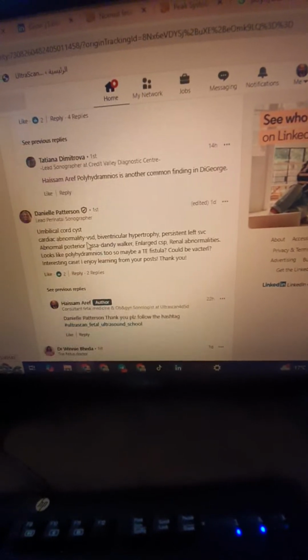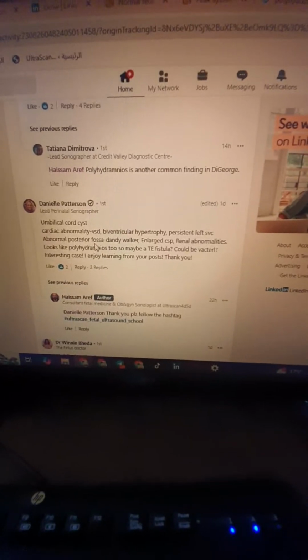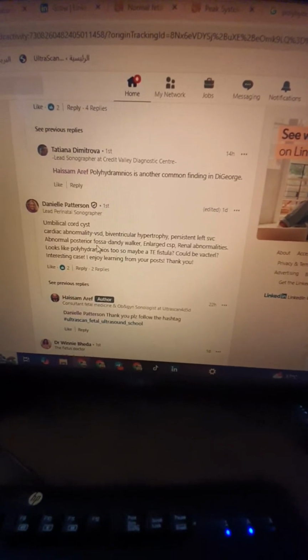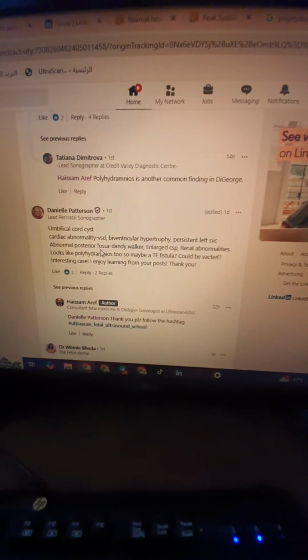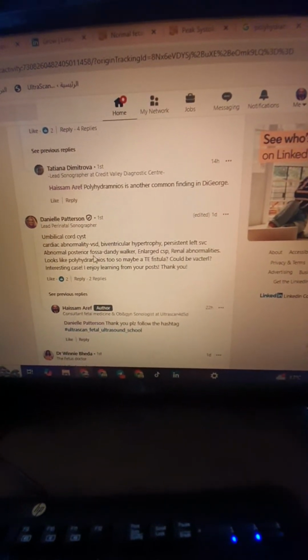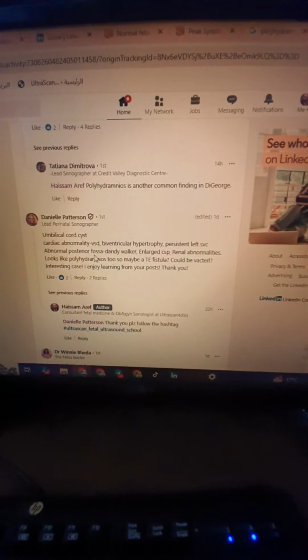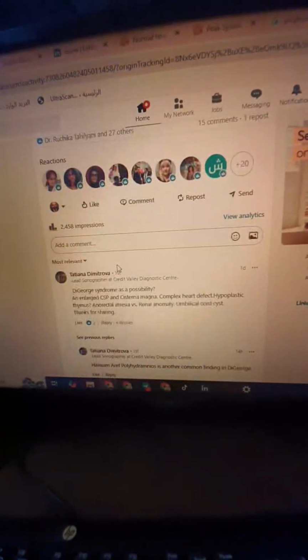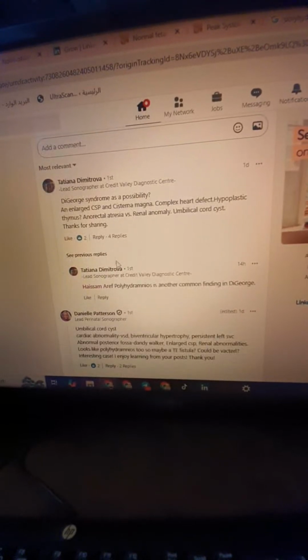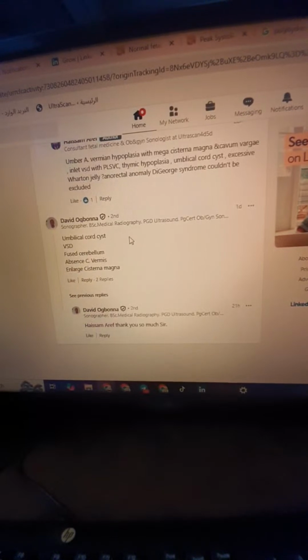So Daniel Peterson said an umbilical cord cyst also, with biventricular hypertrophy, very good, VSD, persistent left superior vena cava, the abnormal posterior fossa, Dandy-Walker variant mostly. So Daniel Peterson, please go think about, like we say, the DiGeorge syndrome.